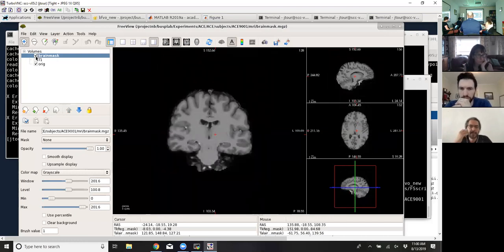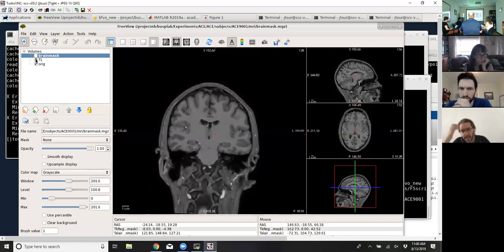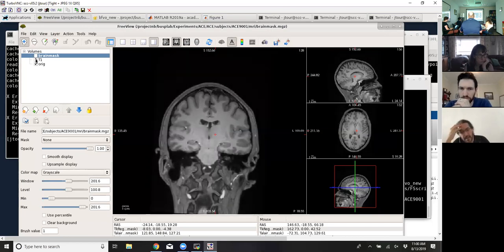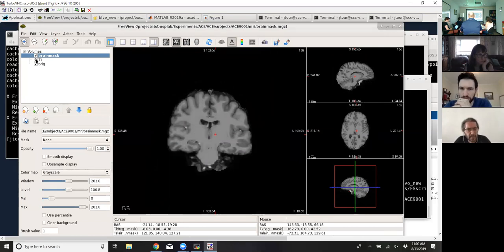The skull has been removed. So T1 seems to be doing some type of bias correction, right? So it's kind of like removing, yep, or at least something like that, or it's some sort of equalization of the histogram or some sort of global bias reduction, because there seems to be a global bias in terms of the intensity values being higher in the most inferior portion of the brain compared to the superior portion, and that seems to be removed in the T1 image compared to the original image. And then brain mask, that's the whole skull stripping thing.